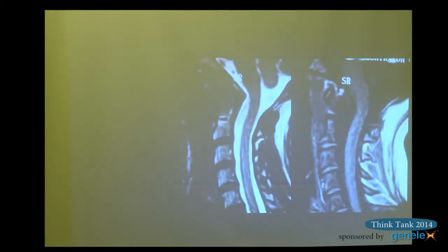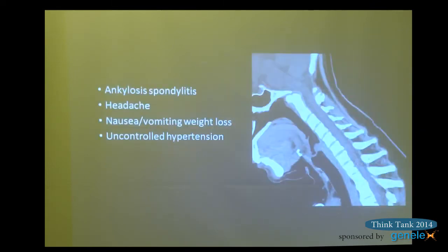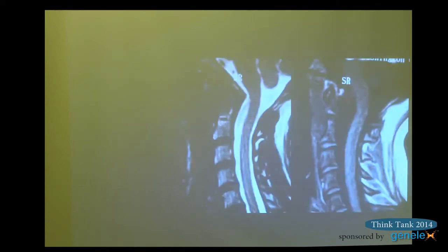This is an MRI, and it doesn't look near as scary on the MRI as it did on the CT at that level. One of the issues with MRI is there's more room for artifacts. That doesn't project it. There's definitely more impingement than this shows. This is the spinal fluid. This is the cord.